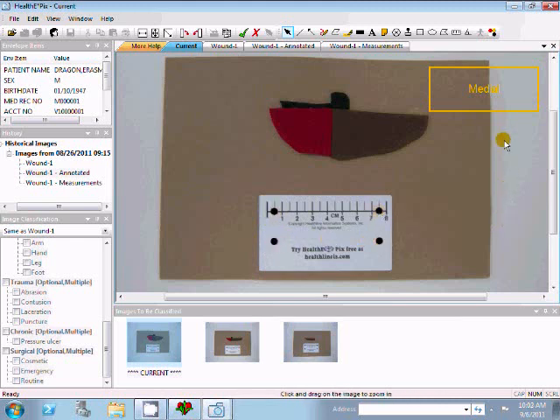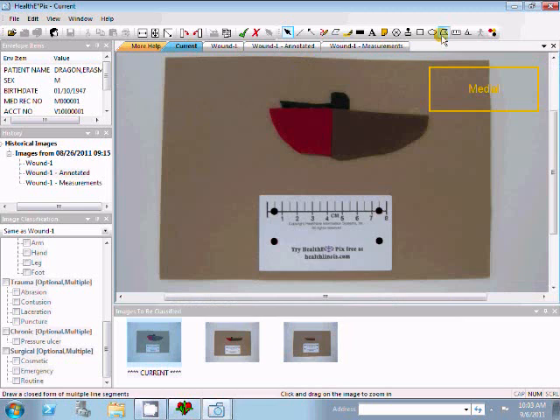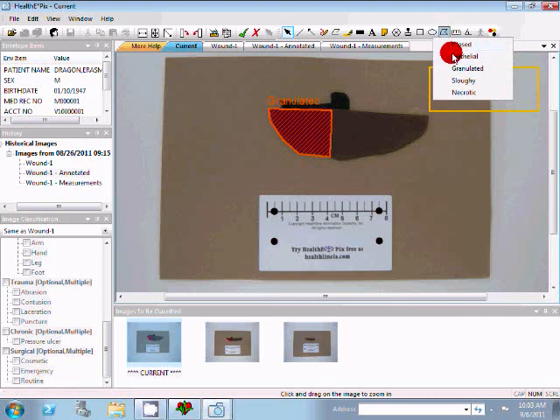So, for example, if I look at the historical image, I can see that there are 3 different tissue types highlighted: necrotic, granulated, and epithelial. Since my patient is returning for treatment of the same wound, I'll measure those same areas. I'll click the polygon annotation, then select granulated, and click points around the granulated tissue. A double click closes the polygon. Then I repeat the process for the epithelial area. And the necrotic area.